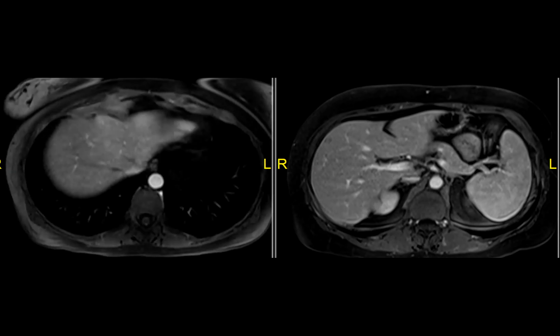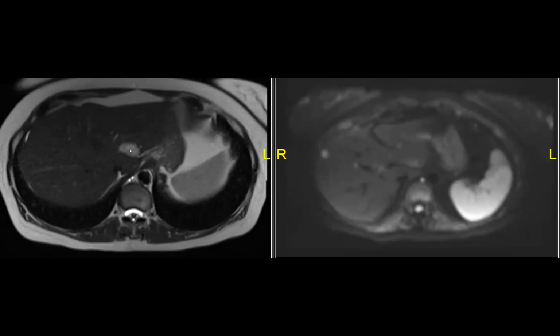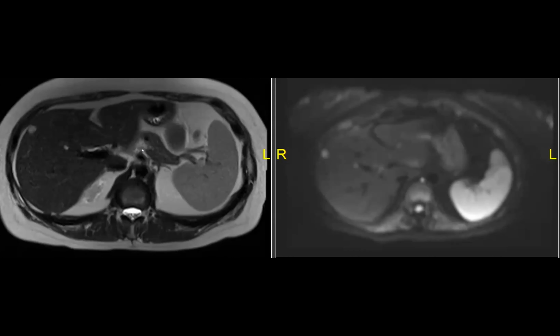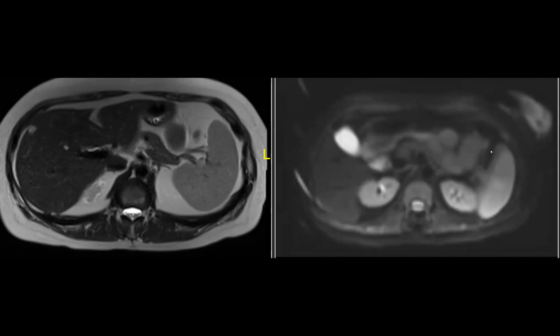Yeah. So then, T2 is kind of not, you want it to be a little bit bright, at least as bright as fat. Yeah, but okay, I'm not saying it's not, but then it gets better. Then we have this thing, right?